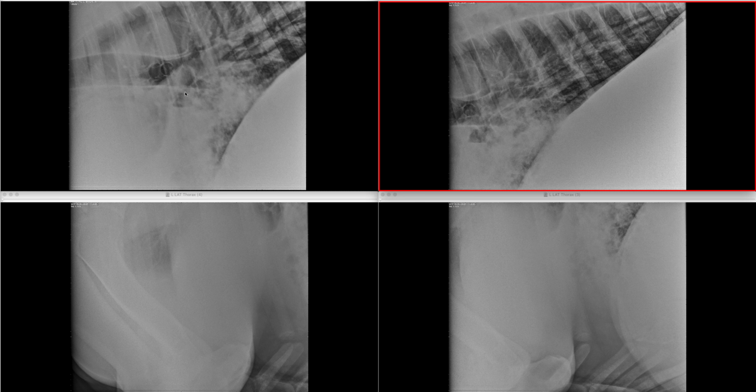As we move further ventrally though, and caudoventrally, we can see that we've got this ill-defined region of fairly opaque tissue just caudal to the carina. It's not at the level of the cardiac silhouette. The cardiac silhouette's further forward, so this is within the lung tissue, we think. It's very fluffy, obscures all of our normal blood vessels, and we can see a semicircle of gas here with a horizontal line and another one here, and a rim here which almost looks like a wall.